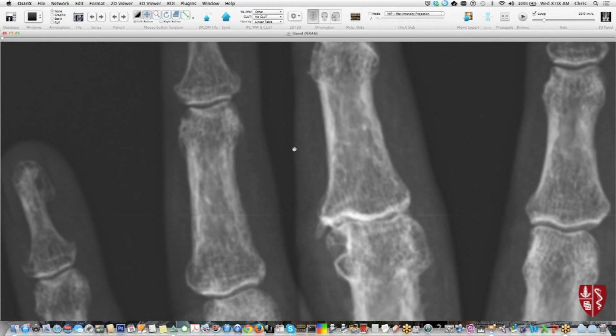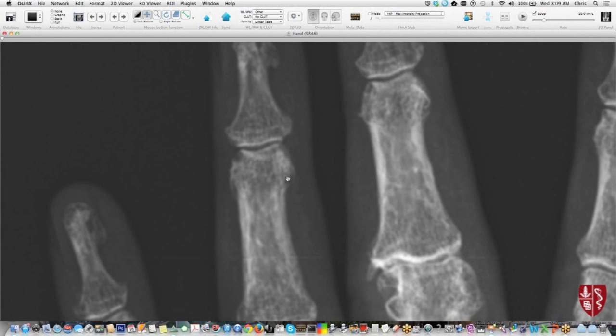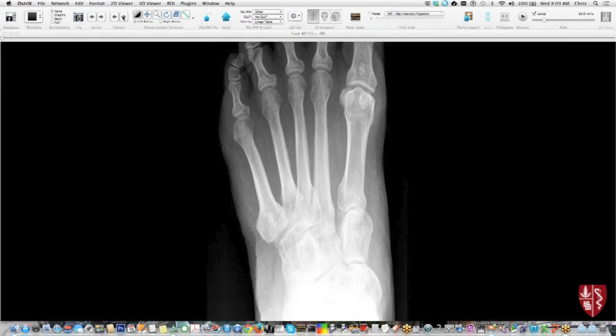So again, as I started out saying, these arthritis cases are very subtle, and you have to look for these subtle findings. And admittedly, we're not always black and white about our diagnosis. We may end up saying possible erosion, raising the possibility of an inflammatory component, and then rely on the clinical information to help make the diagnosis more firm. Sometimes it requires a joint aspiration, usually done in the clinic, possibly looking for crystals, possibly looking for other signs of infection or inflammatory markers.